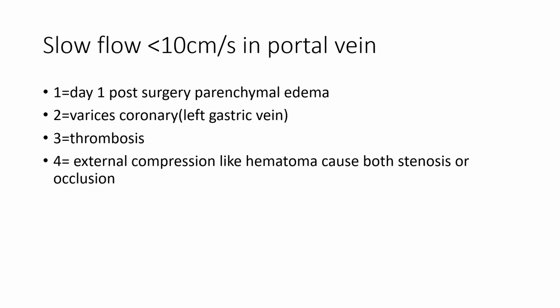If it persists, it shows varices, coronary left gastric vein near the esophagus or gastric, that cause hematemesis, thrombosis causing a slow flow, or external compression due to hematoma.